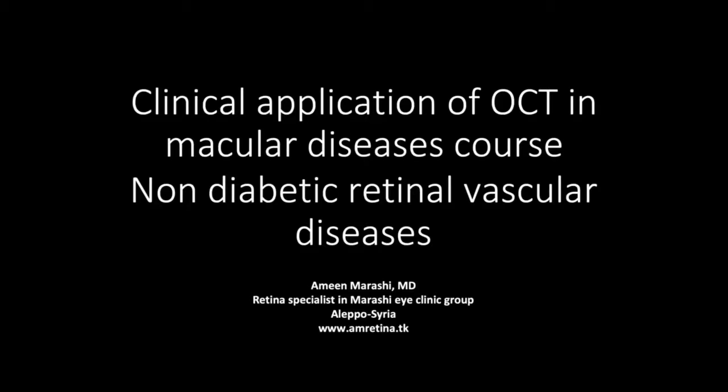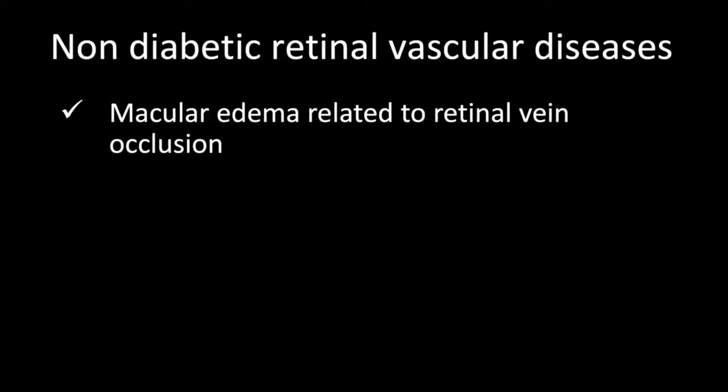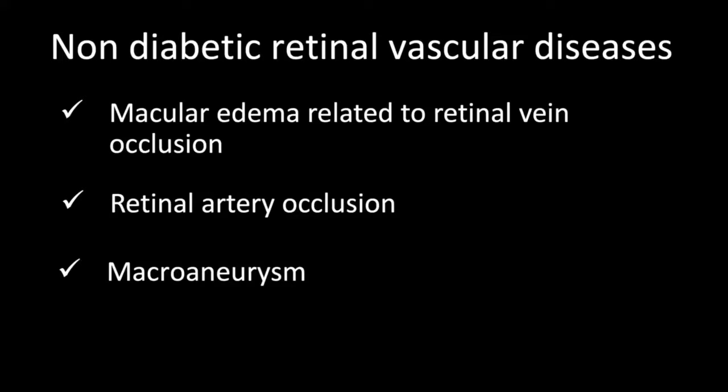I am presenting the course of OCT for macular diseases. In the previous presentation, I discussed diabetic macular edema. In this presentation, I will discuss OCT's clinical applications in non-diabetic retinal vascular diseases, including macular edema related to retinal vein occlusion, retinal artery occlusion, macroaneurysm, and macular telangiectasia.